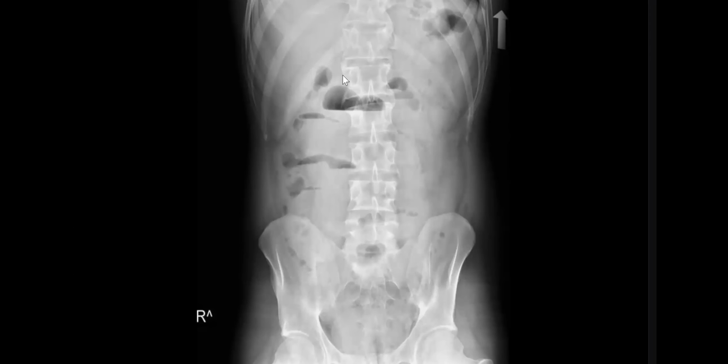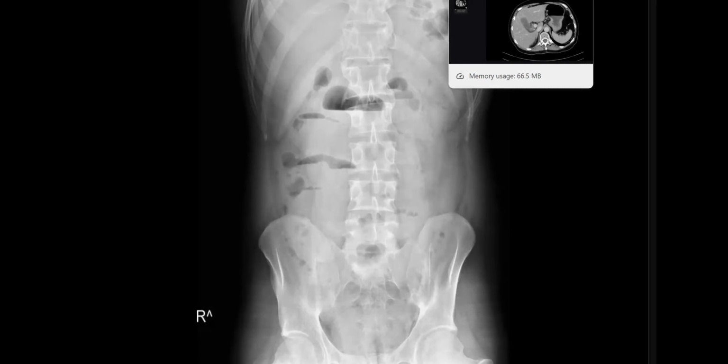You see some bamboo spine and some sacroiliitis. It's another finding in case of small bowel obstruction. If you see a small bowel obstruction, comment on the presence or absence of surgical clips, radiopaque shadow, hernial orifices, linear lucency, overlying. So many causes can be detected on the plain radiograph. Very good, my friend. Now to the last case.